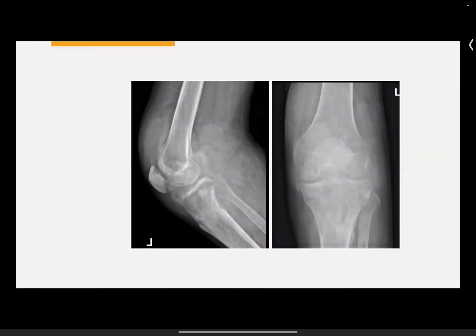Okay, talking about crystal arthropathy, in this case he was a prisoner presenting with worsening pain. He was in a wheelchair, can't stand, with a limited range of movement in the left knee. As you can see on this AP X-ray, there is focal lucency in the proximal tibia, but over here there's a bit of scalloping, and all that cloudy, lobulated, mass-like appearance around the knee, in the suprapatellar pouch, and there.